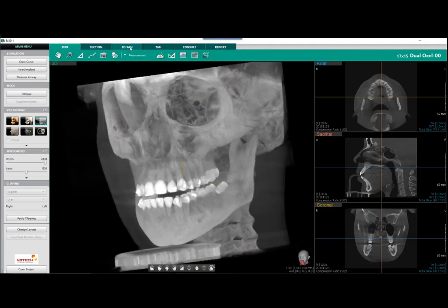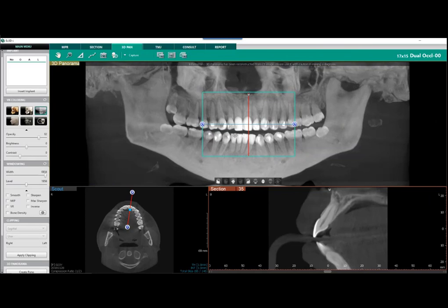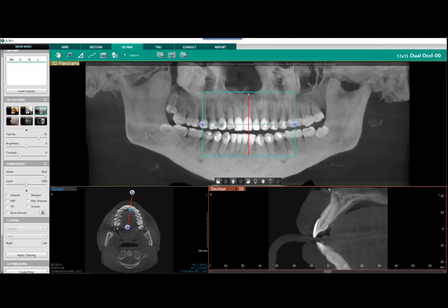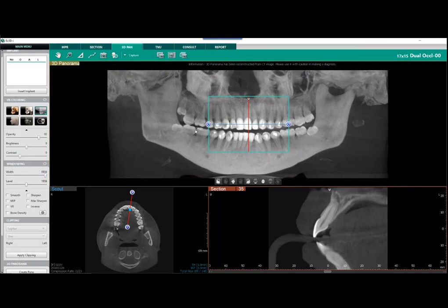All right. I got another one, Jim. Sure. What do you have there, Paul? I think it applies. It says my 3D pan doesn't look like that. It looks a little distorted. How do we fix that? Good question. So what we're referring to is our 3D pan window. This gives us a nice rendered pan through here. Sometimes we may want to recreate a reconstructed 3D pan here.